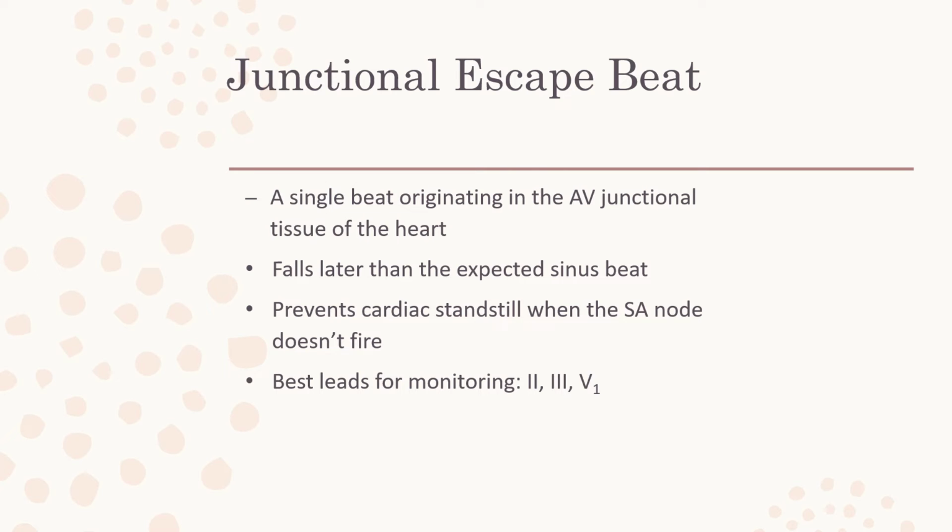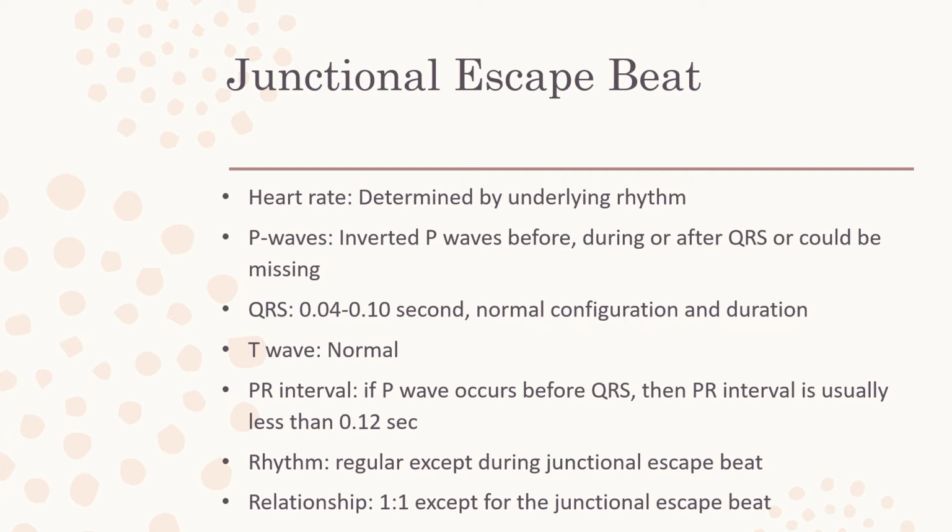So junctional escape beats: it's a single beat originating in the AV junctional tissue of the heart. It falls later, not earlier, than the expected sinus beat. It prevents cardiac standstill when the SA node doesn't fire. The best leads for monitoring this are 2, 3, and V1.